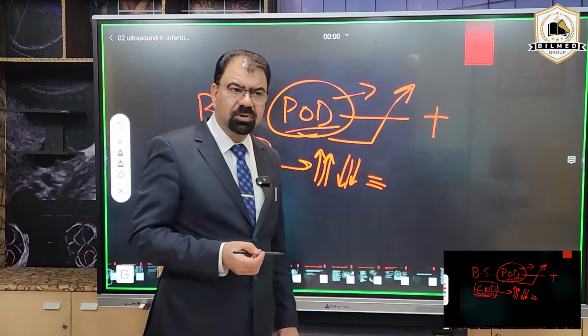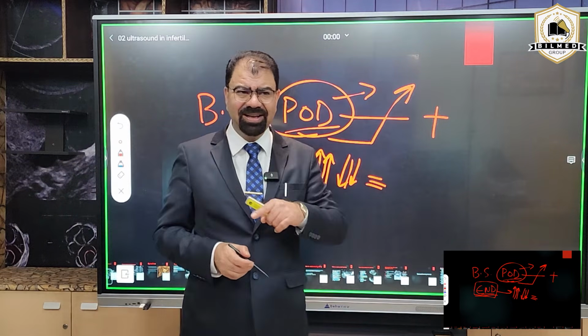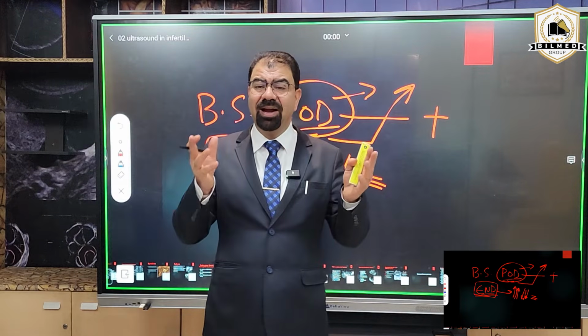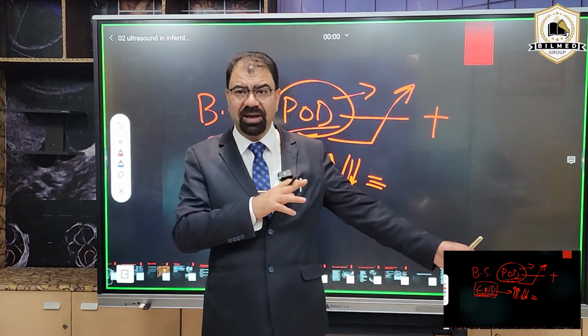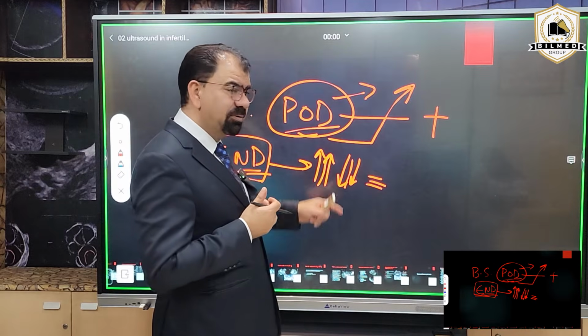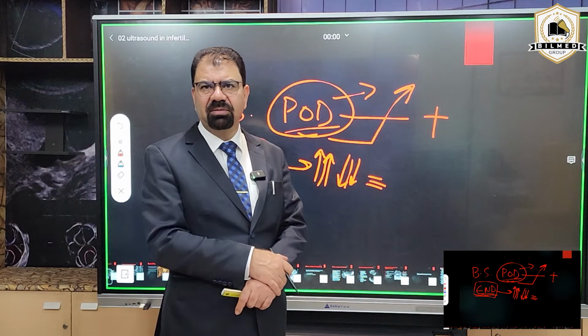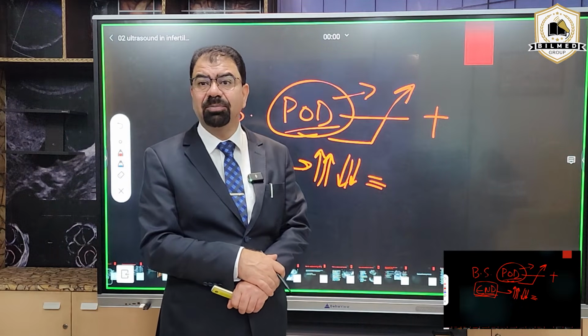Any comment? Decrease. No, it will increase. It has to increase, because now we have a thicker endometrium. We are now changing from the phase. But if it is the same, then that POD fluid, if seen, is telling me, doctor, think tens of times before labeling this follicle as a ruptured follicle.